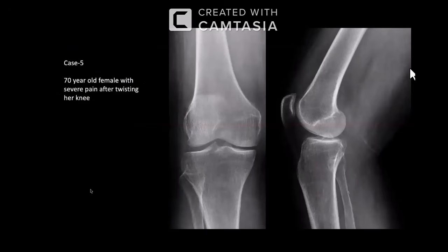All right, so next case, you can take this case. Yes, sir. I've been provided with frontal and lateral radiograph of the knee joint. I'll take few moments to go through the radiograph.